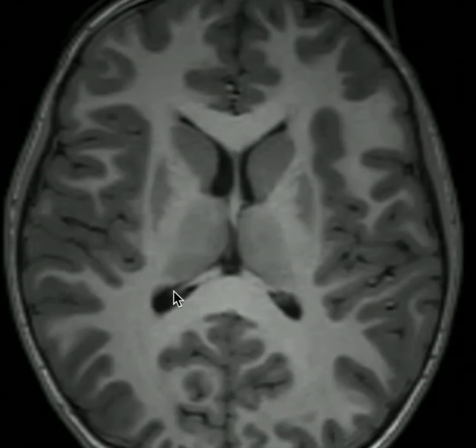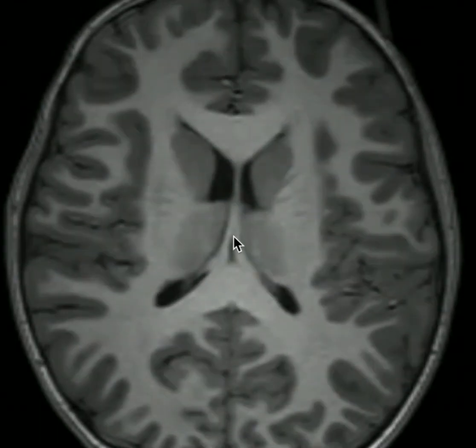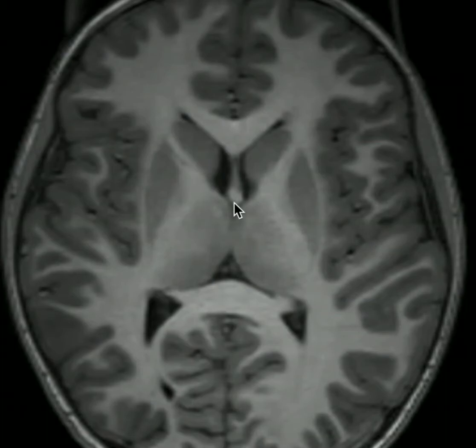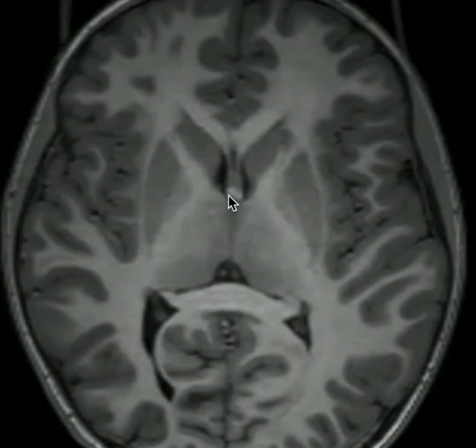They will come together at this point called the commissure of the fornix, also known as the hippocampal commissure, right here. At this point, they are known as the body of the fornix. Scrolling back inferiorly from this point now, we can see our body of the fornix until it becomes the columns more anteriorly. Here we see it dividing into the right and left columns of the fornix.